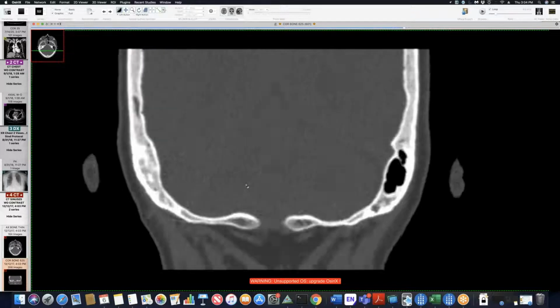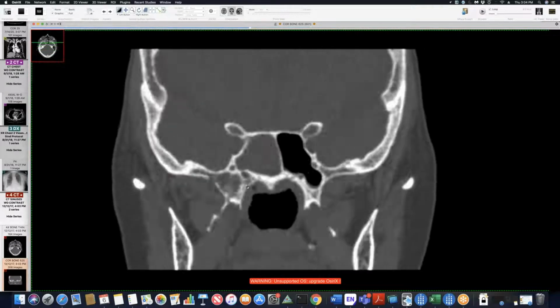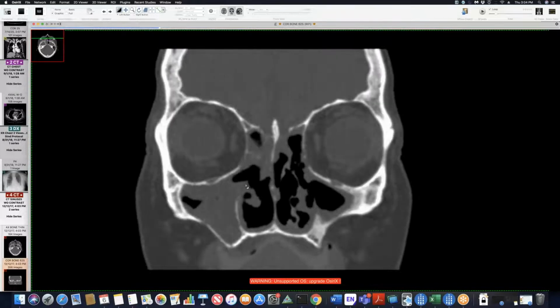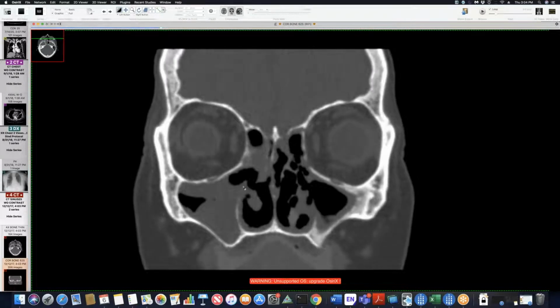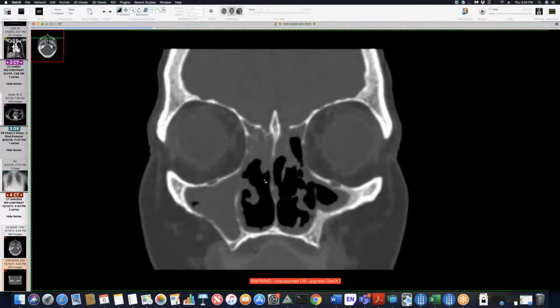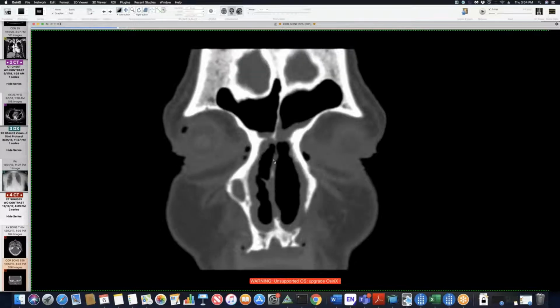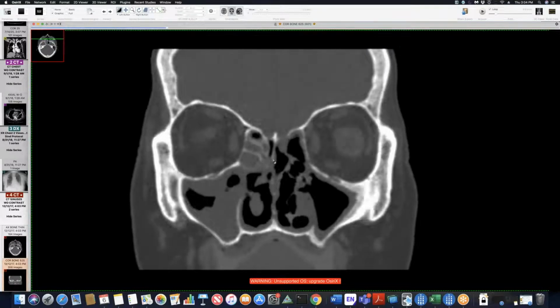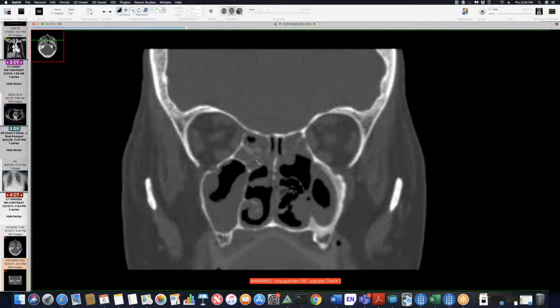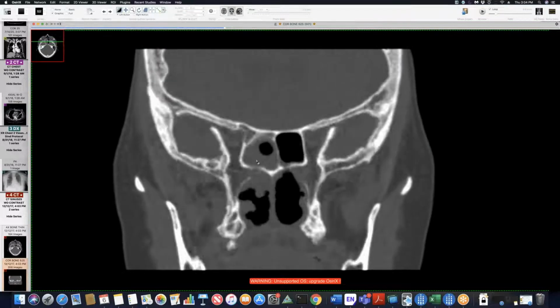And so you can see in the paranasal sinuses, there's all this polypoid soft tissue, maxillary sinuses, ethmoid air cells. There's also bony dehiscence. We can go forward, there's involvement of the frontal sinuses and dehiscence here, the lamina papyracea, and we go posteriorly, the sphenoids are also involved.